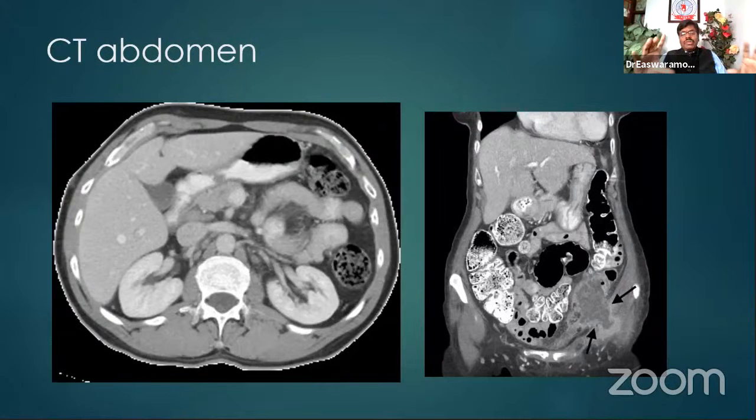This is one of the commonest pictures all of you will be seeing for the rest of your life. And this is the liver, right kidney, left kidney, small bowel loops, stomach with the air and also a little bit of contrast in the stomach. Anterior abdominal wall musculature, fat and skin, okay, all around. You can see this chap is not very obese, looking at the thickness of the wall. Some people will have about 2-3 centimeters, you can say obesity.